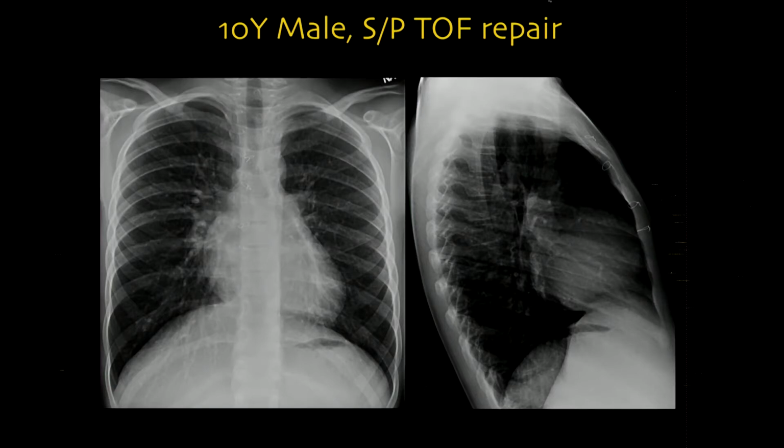So this is another message I really want to give you. Chest X-ray is surprisingly very good in detecting asymmetric vascularity. However, most people are shy in describing that there is asymmetry, just for fear of a wrong answer. But if you look here, look at the size of the pulmonary artery here to here, and the peripheral vessels here and here. There are certainly more prominent vessels here than here. In the lateral view, the anterior pulmonary artery is big, and posteriorly there is none. So you have here, can you see the airway coming down?